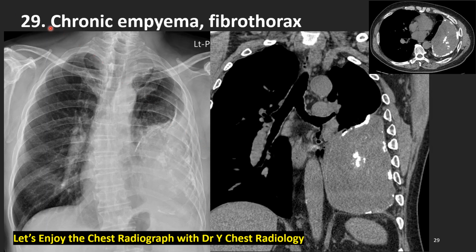This slide shows the chronic tuberculosis empyema. We sometimes interchangeably use the term fibrothorax for these findings, fibrothorax or chronic TB empyema. Let's look at the chest radiograph. The right side is looking good. This is the gold standard for comparison. What happened to his left side?